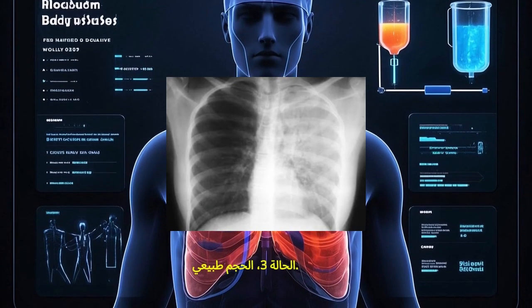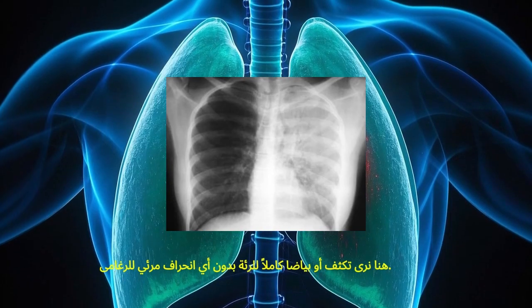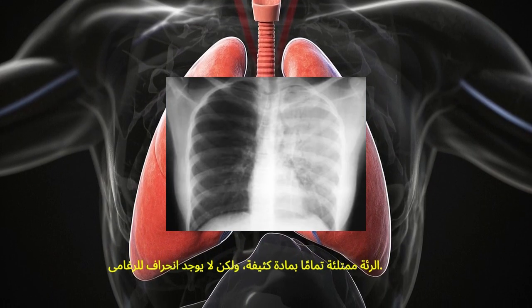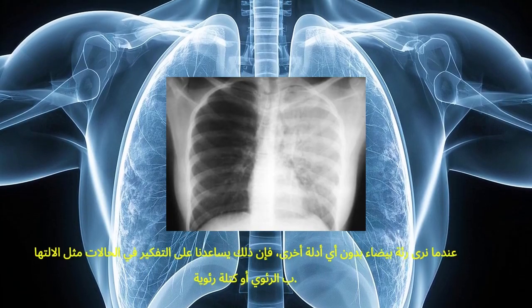Case 3. Normal volume. Here we see full lung opacity without any visible tracheal deviation. The lung is completely filled with a dense material, but there's no shift of the trachea. When we see an opaque lung without any other clues, it helps us think of conditions that affect the lung tissue, such as pneumonia or a mass.